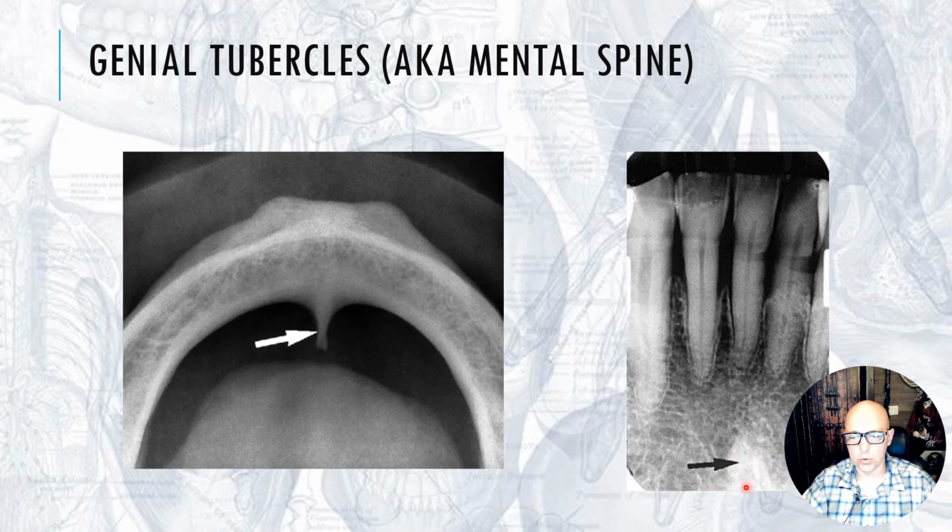It can be, usually it's around another structure we're going to talk about in a minute, which is the lingual foramen. So remember, foramen, it should look radiolucent. If I'm talking about tubercles, that's a projection of bone. A spine of bone is a sharp projection of bone, so you can call it a tubercle or a spine. Mental, just meaning the mentum region, the region of the chin.